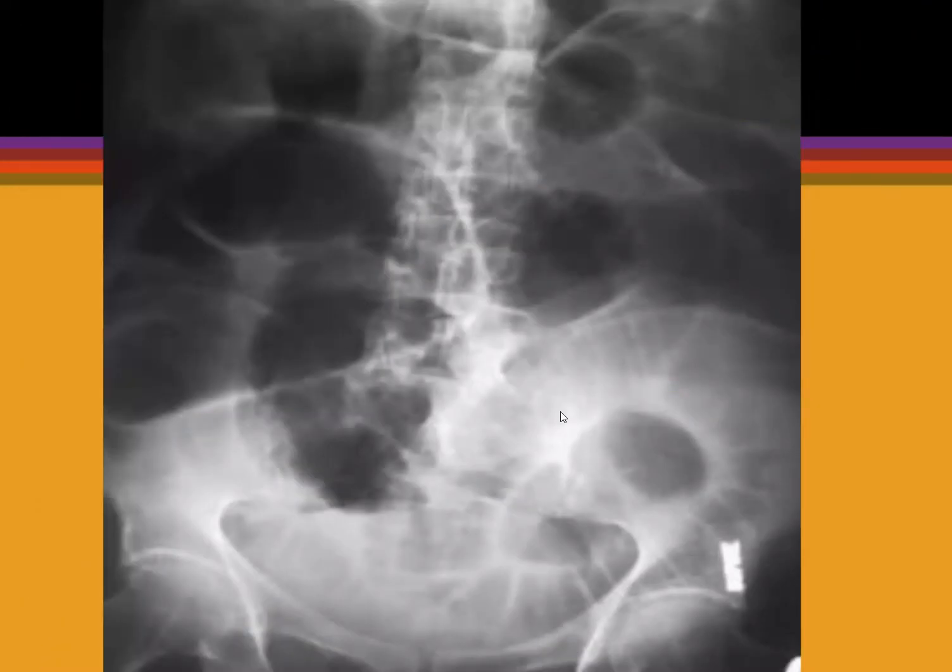Here again, small bowel dilatation. You can see these small bowel loops, so many of them, overlapping each other. The distinguishing feature are these transverse valvulae conniventes. This is fairly severe small bowel dilatation. It doesn't look like it's perforated because I can't see a Rigler sign. But look at the distribution. It's more central. The large bowel is essentially decompressed and just displaced peripherally.